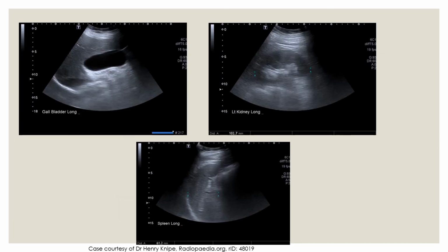And so these are other ultrasound images of the same patient. These are all normal examinations. Here we have a normal kidney, and we measure the kidney in bipolar length. As you can see, the cortex of the kidney is slightly hypoechoic, which is slightly low in echoes, and the renal sinus here is high in it, which is called hyperechoic, which means high in echo signals. This generally just reflects how many ultrasound waves are reflected back and how many actually just pass through.